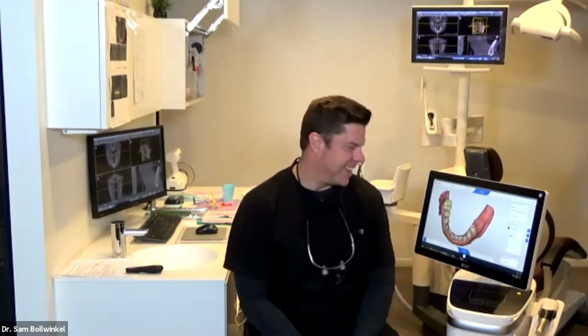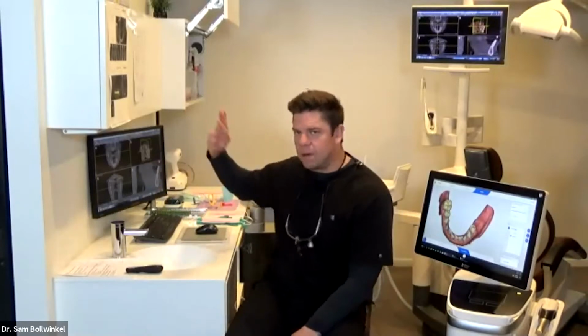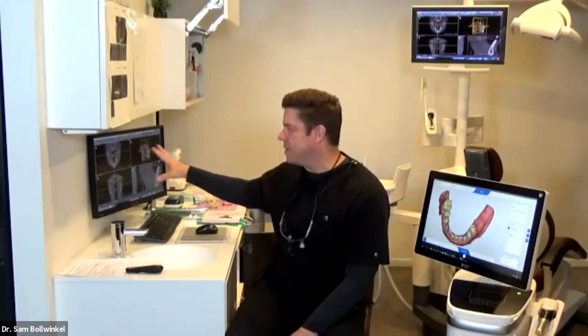Great question. Lastly, which tech of all the awesome tech behind you would you recommend? So the question is, if you didn't hear it, which tech of all of this tech in our playground, all these toys, which one could I not live without? So that's a leading question. Let me show you what's behind me. We've got CEREC, if you're not familiar with CEREC, it's a direct image capture. It's all digital. You've got the cone beam image. The cone beam's in the hallway, so you don't see it, but the image is there.